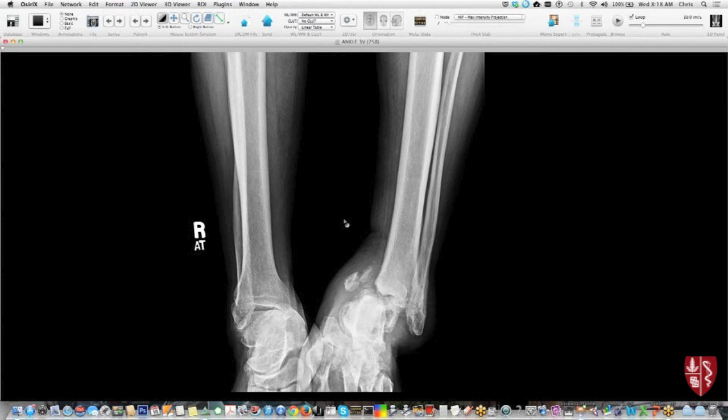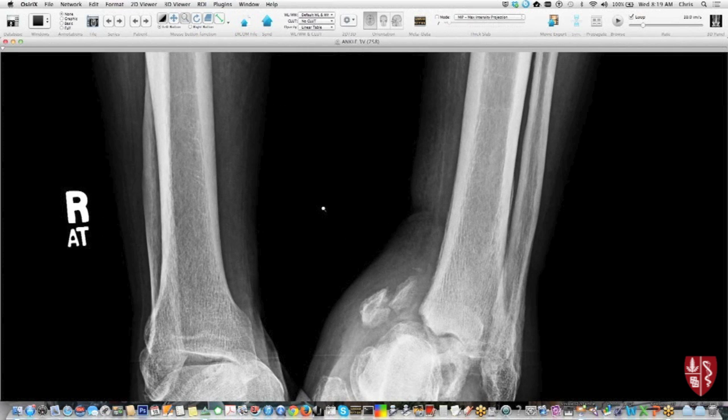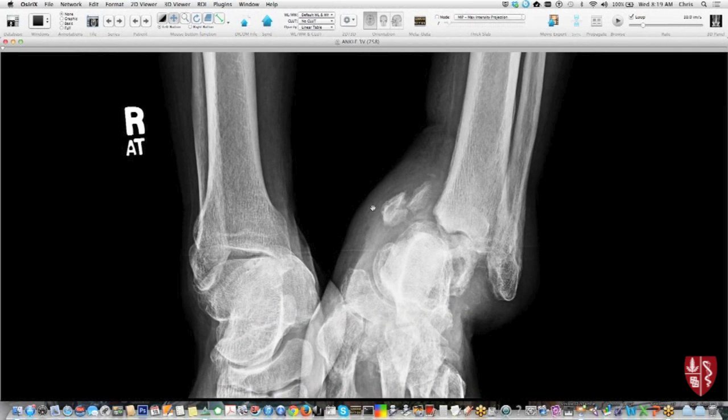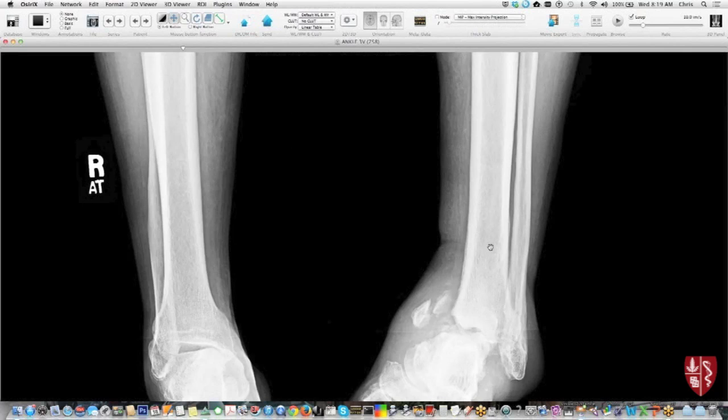Ankles, so a different patient, and maybe one or two last cases here. Bilateral ankles imaged on one image here, and you can see there's obviously a lot going on in this left ankle, right? It may be that this is an ER patient who came in with ankle pain, but you just think, boy, that would be a really nasty fracture to occur. So when you see this degree of disorganization, bone fragments, a lot of soft tissue swelling, in a patient who may or may not have even that much pain, what should that make you think of?